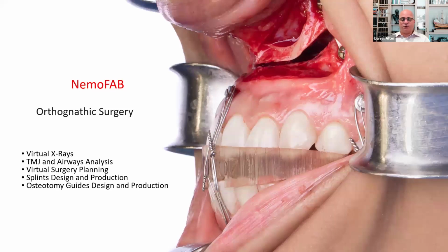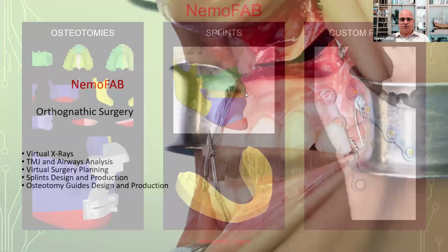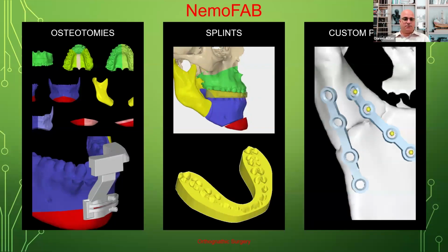The software really makes it that much easier. It allows you to do virtual surgery planning, create splint designs and productions, as well as osteotomy guides and production. So what you end up with is osteotomies like this. The design you can certainly do, but if it's splints for TMJ, you can remove, shorten or lengthen. As you see here, you can create these jigs for the chins.